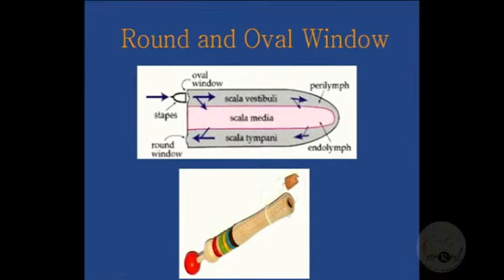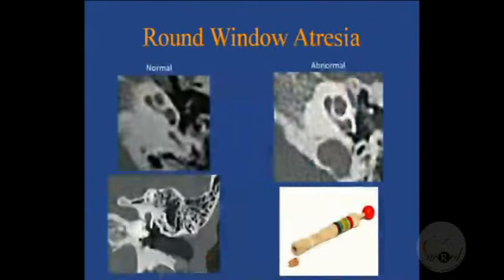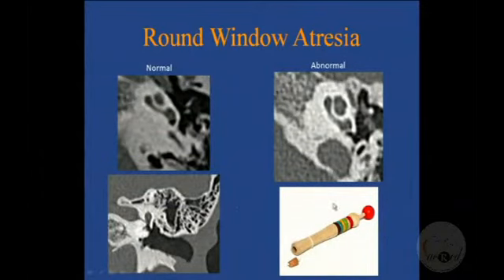And this is the air in the niche, which is part of the middle ear. That's the perilymph, membrane, and air. Same structures here. That's the vestibule. That's the perilymph. That's the air which you see in this area here. And there's a membrane here usually.